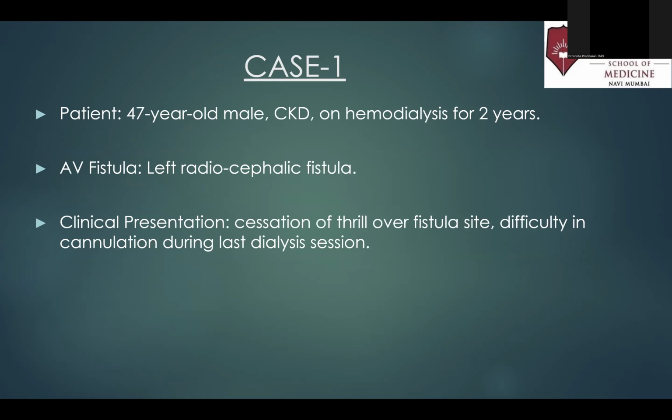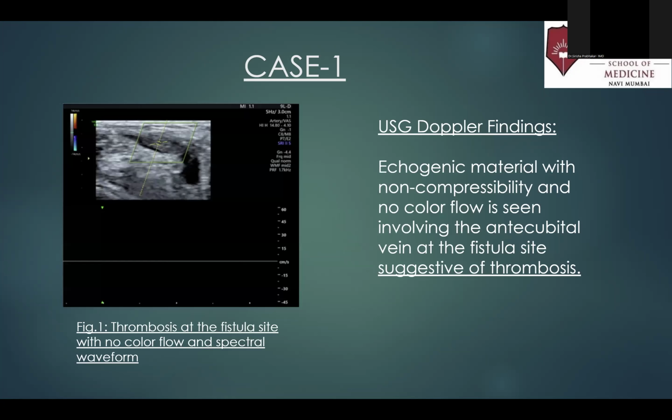The first case was a 47-year-old male patient, CKD, on hemodialysis for 2 years. There was a left radiocephalic fistula. The patient presented with cessation of thrill over the fistula site and difficulty in cannulation during the last dialysis session. When a Doppler was done, we found echogenic material in the antecubital vein, which was non-compressible with no color flow seen, suggestive of thrombosis.